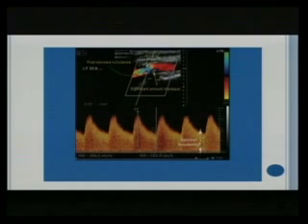And another example I wanted to bring to you to tell you what is spectral broadening. Spectral broadening is when the entire waveform is standing on a pedestal. It looks like the waveform should just go up like this normally, but here it looks like it's standing on a pedestal, and this is spectral broadening, and this filling in is called the spectral fill-in.